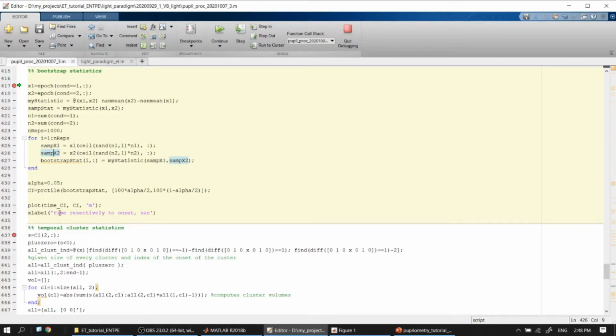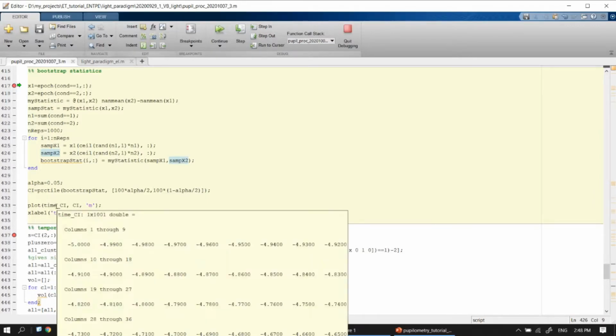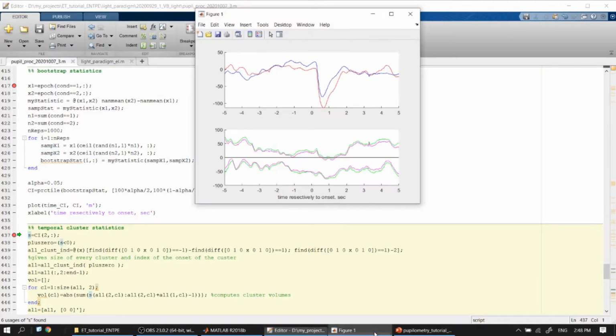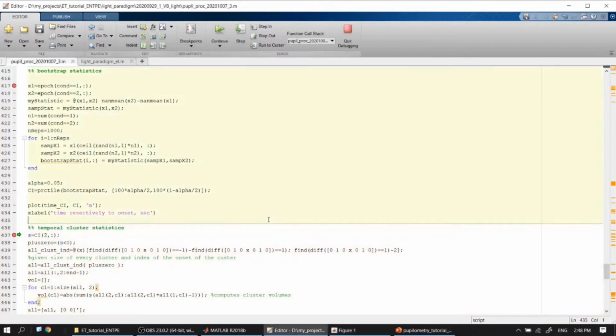And we will plot those two borders as another confidence interval in magenta color. That's it. And as for me, it looks somewhat better than the t-test. In general, Bootstrap can be more sensitive than the t-test.